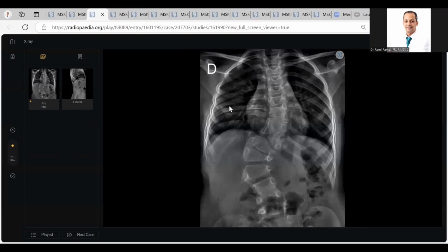I have been provided with a 20-year-old male patient with chronic scoliosis. I have been provided with a frontal radiograph of the chest and abdomen. Looking at the radiograph, I have noticed there is a deformity within the vertebral bodies of the thoracic and lumbar region, and there is a significant scoliotic deformity with concavity towards the left side. How could you measure the scoliosis angle, and what is the value?